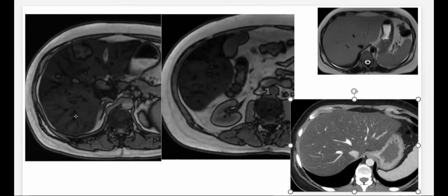Thank you. That's awesome. Yashant, do you happen to know what the maximum amount of fat is that you could get in your liver, percentage wise? I did not find anything, but I can double check. Okay. Because this would suggest, if you're getting the dropout, I know we always get the maximal amount of dropout, like the India ink, if there's 50-50 fat and water, right? So that would suggest this is like 50% fat or something. But I'm just kind of curious what the max is.